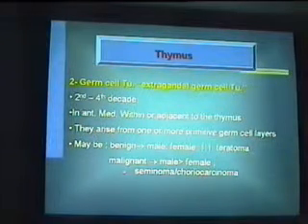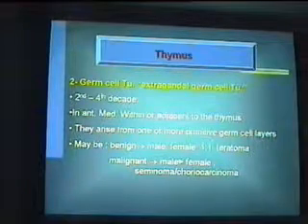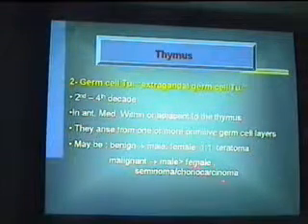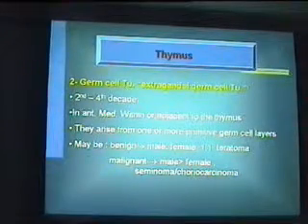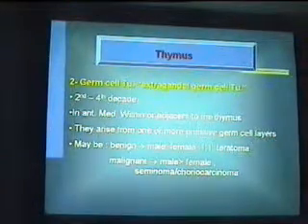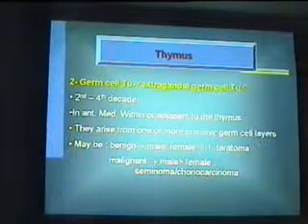The germ cell tumor may be benign, what we call the teratoma, or malignant in the males في seminoma وفي الفيميلز في choriocarcinoma. طبعا the males are far much common to harbor malignant germ cell tumor than the females. يعني السيمانوما أشهر كتير من الكوريوكارسينوما في الميديستان.